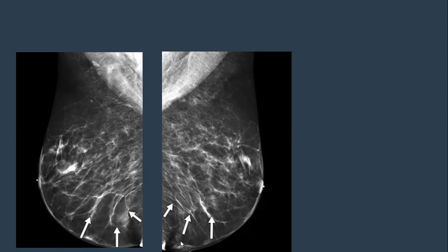This is skin thickening going down and irregular due to scarring. Scar is usually from the nipple inferiorly, and look, the nipples are pointing up, not like the normal. The breast is lifted up. You see, these are the clues for bilateral mammoplasty.